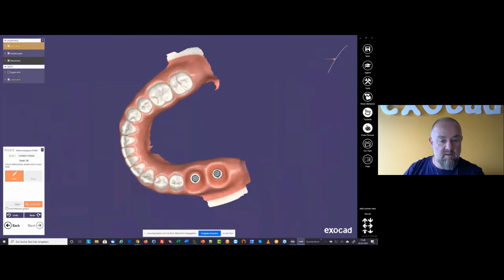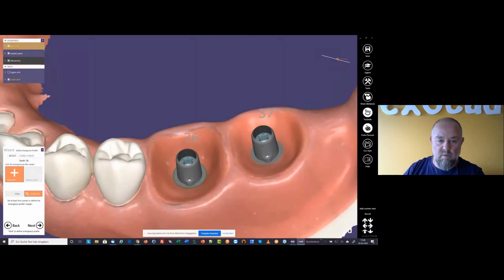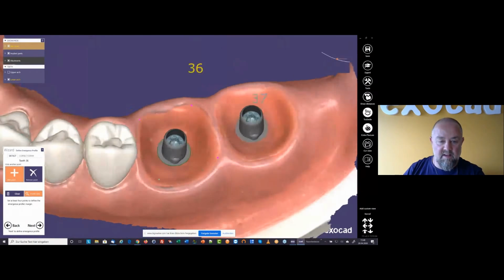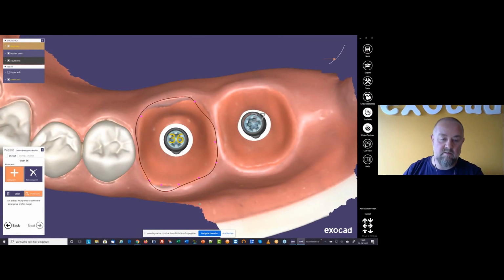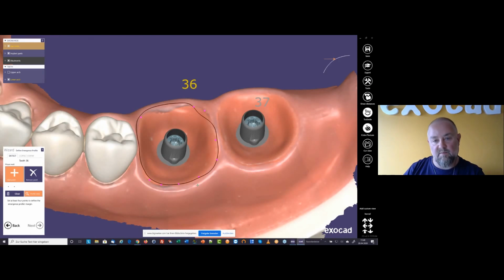And let's go to the 36 and try the automatic detection, which will obviously not work perfectly here in this case because this edge is quite thick. You see, but you can easily add additional points to help the algorithm find the area you'd like it to detect.